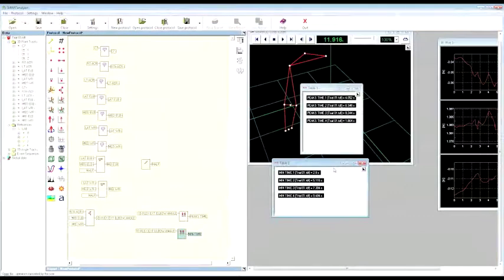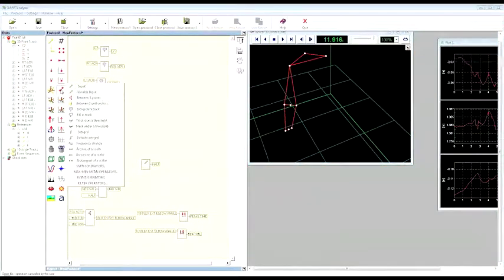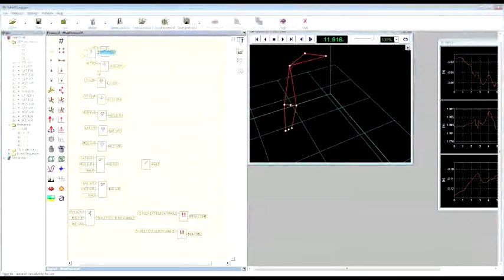Now, if we want to compute the range of motion of the angle, we need to know the value of the angle in correspondence of each event. In order to do that, we can click on 1D angle, look at the within event operator, and select event defined value.